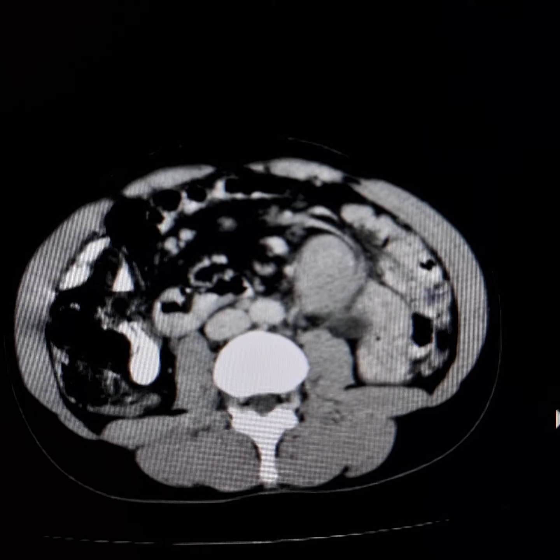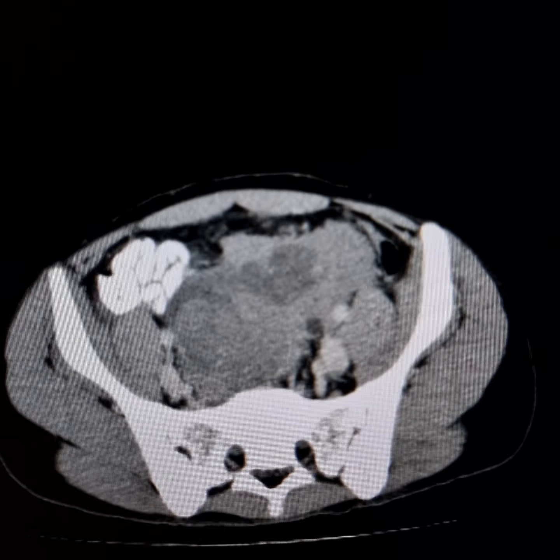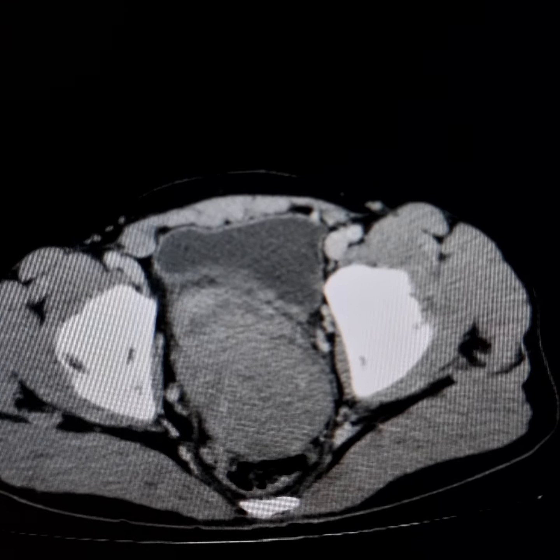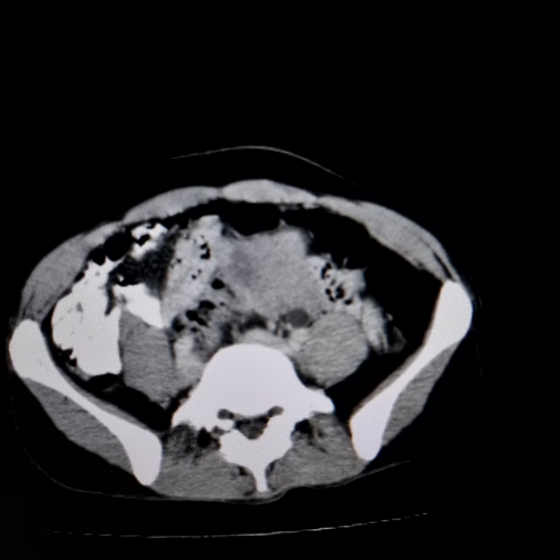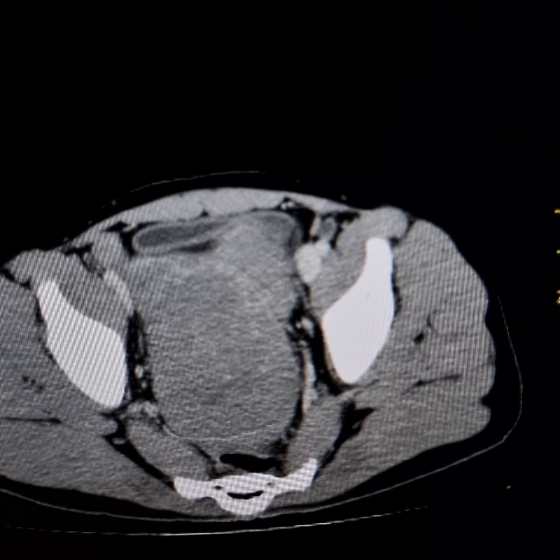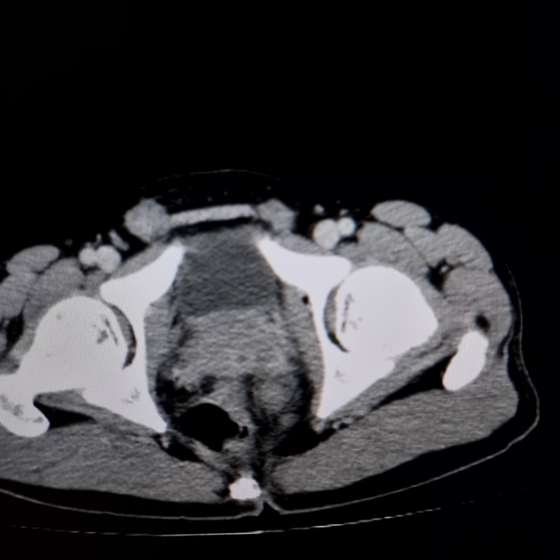As I scroll it down, this is the dilated left ureter. There is a large mass in the pelvis. It shows non-homogeneous enhancement. Its interfaces with the adjacent small and large gut segments are indistinct. There is no involvement of the urinary bladder. It extends downwards into the pelvis posterior to the urinary bladder.